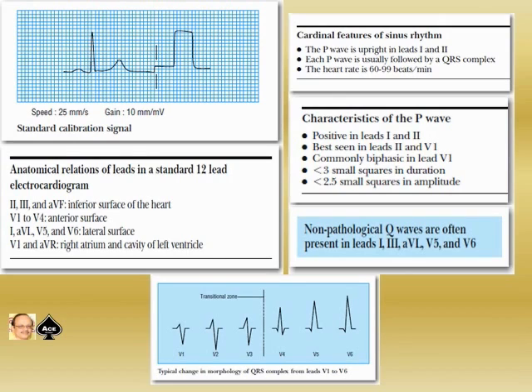And in this frame I am showing you the standard calibration signal, a speed of 25 mm per second, and a voltage of 10 mm showing 1 millivolt.